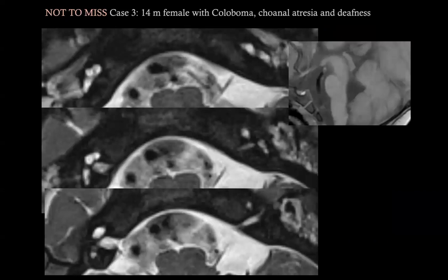Finally, look at this case, abnormal posterior fossa. The vermis finishes here. This is the hemisphere, it's a partial volume, but the vermis is small. The pons is very, very small. Look at the cochlea. The cochlea is small. There is a basal turn, nothing much here. It's not the normal cochlea I've shown you before. In this other case, it's just a little bud. There is a little cyst. There is no cochlea at all.